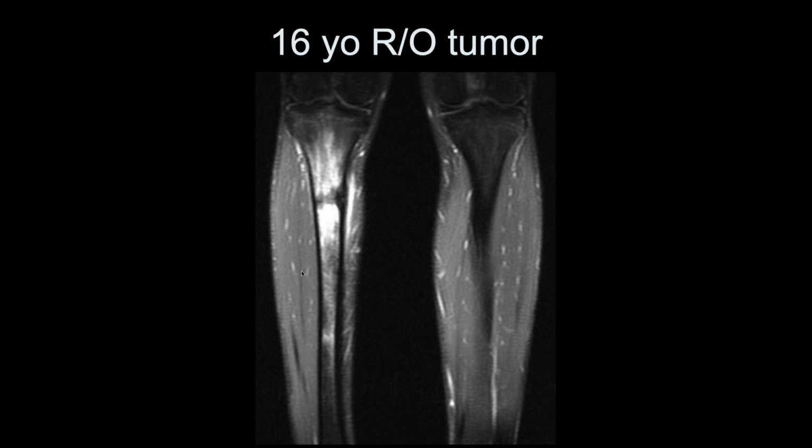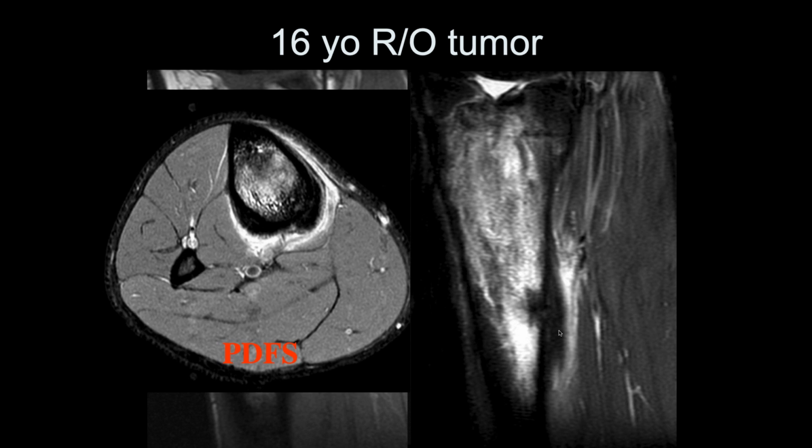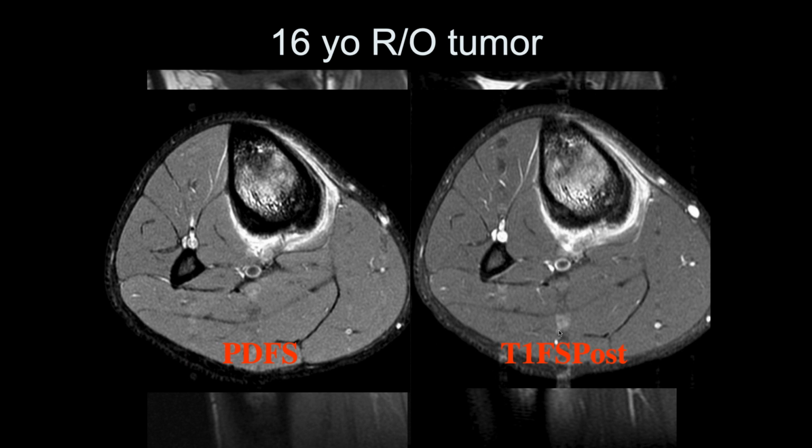Okay, so it's markedly increased signal within that proximal tibia, kind of throughout, with the low signal transverse area you're pointing out. So again, we see all the edema. We see a periosteal reaction posteriorly where there's low signal. There's a little bit of edema within the surrounding muscle as well. So again, periosteal reaction, surrounding soft tissue edema and edema within the bone, and the soleus enhances as well. So I think it's kind of similar to the prior study where you have to give a differential.